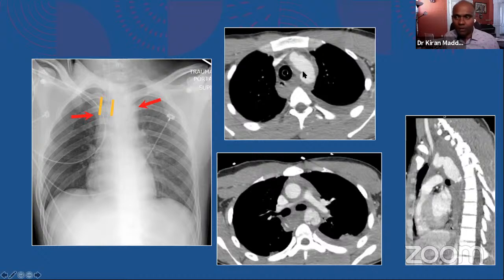To be specific, if anybody is reading your physiology and pathophysiologies of aortic injuries or aortic dissections, this is called intimomedial flaps. Earlier, they used to call it intimal flaps, but now the pathology research says that it has both intima and also media in it. So that they are known as intimomedial flaps. Remember your basic anatomy of the aorta. It has the aortic wall, which is adventitia, and then the media, and then the intima. So this is an intimomedial flap here.